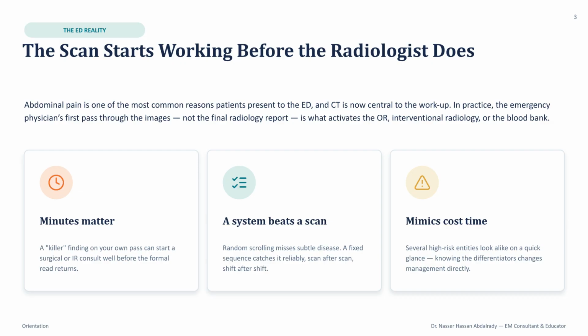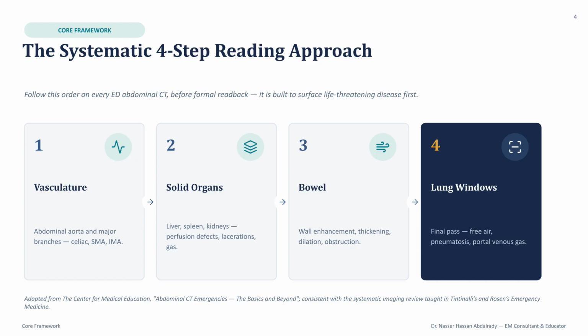In the ED, your initial pass through the CT images is often what activates urgent care, like surgery or interventional radiology, long before the final radiologist report is available. Follow this systematic four-step approach for every scan.